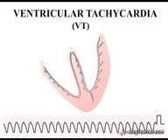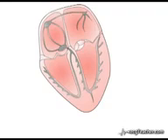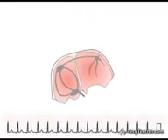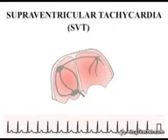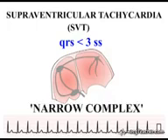For the reasons outlined in the video on ectopic beats, tachyarrhythmias arising from a focus in this region are associated with broad QRS complexes. Tachycardia arising from a focus in or anywhere above the bundle of His is called a supraventricular tachycardia. In this case, as the depolarization wave generated must enter the ventricles via the AV node and therefore the ventricular conducting system, a tachyarrhythmia arising from anywhere in this region is usually associated with QRS complexes of normal duration, a so-called narrow complex tachycardia.